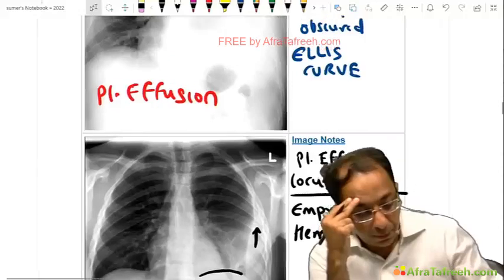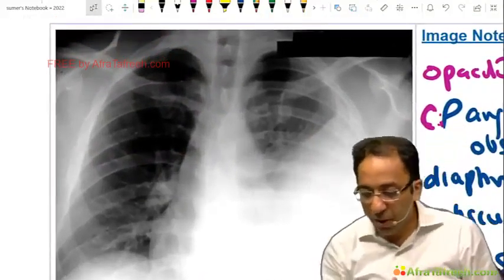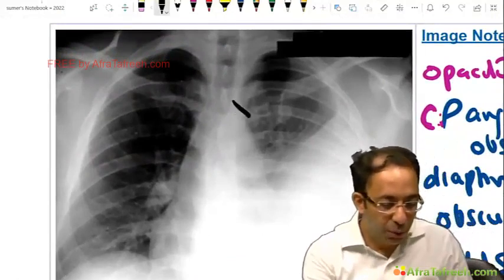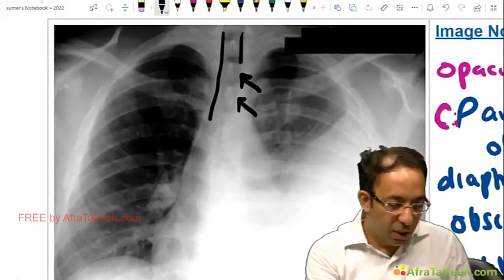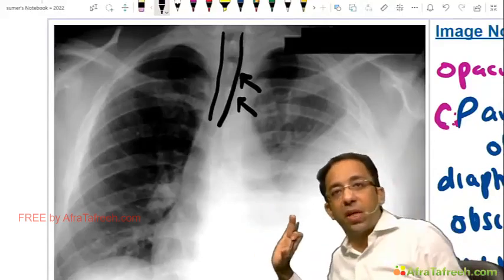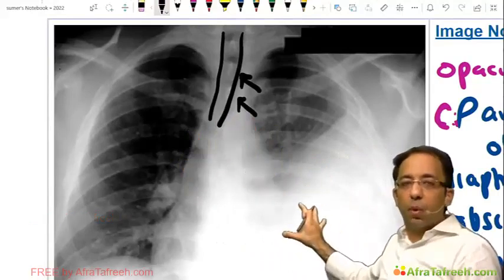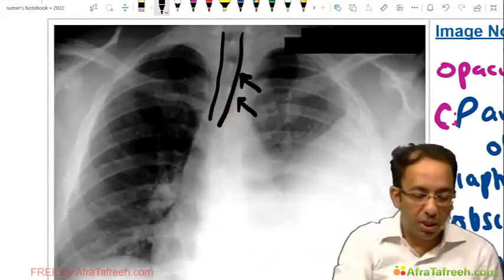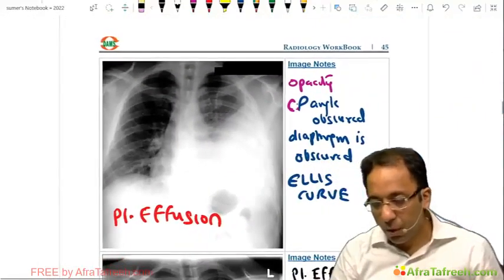Okay, everybody follows? Now I also see one of the students, Sneh, has pointed out, sir, look at the trachea too. That is absolutely right. If you look at the trachea, this is the trachea of this patient. Can you see it is slightly pushed to the other side? Pushed to the other side because of the pleural effusion sitting here. It is pushed to the other side as in the previous X-ray. Okay.